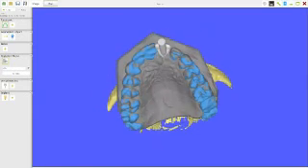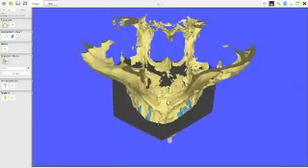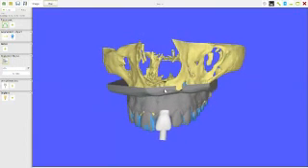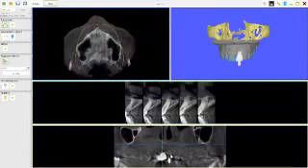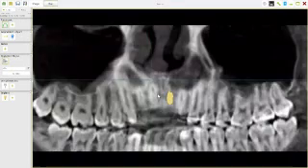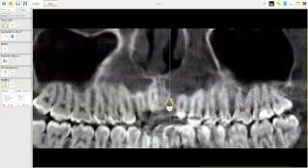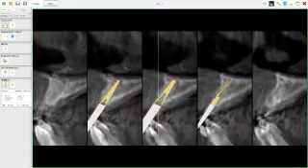So this would work out okay for a screw retained central incisor, if this is what we want to go for. And this might be a very nice one to go for screw retained. So we've got a 15mm, 3.75 implant, screw retained. We can click out of that again, and I can go to the pan view, and by twisting the ball on my mouse, I can see the position there. I can position the green lines over to there.